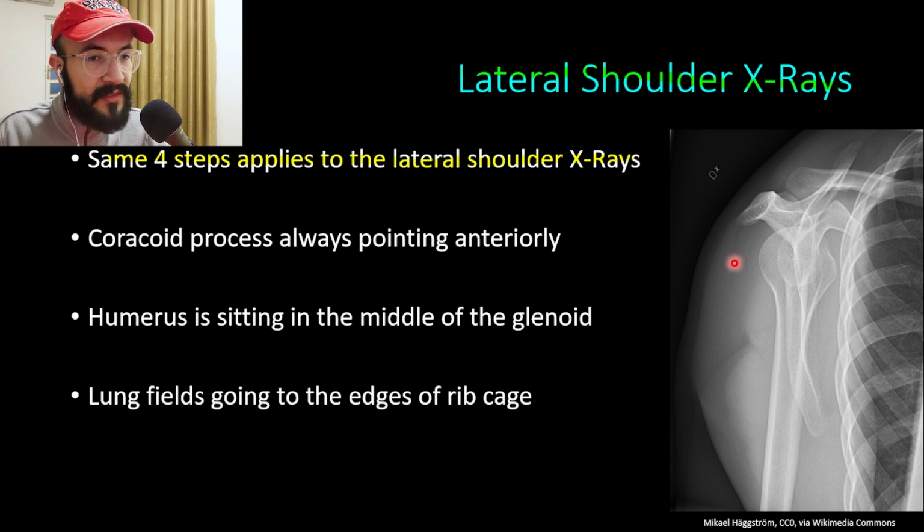Then we move on to the glenoid of the scapula, looking for any fractures. Then we look into the coracoid here and the acromion, looking for any cracks. Then we move on to the spine of the scapula here, and then we look into the scapula body here, looking for any cracks. And finally, we look into the clavicle here. As we can see, it all looks normal. Then we assess the joints.